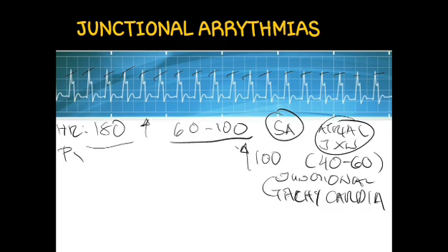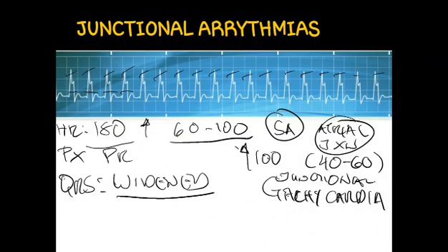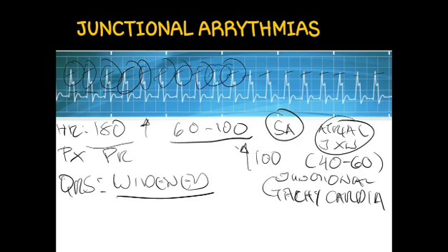So again, P wave is absent and we cannot determine PR interval, but then the QRS complex, as you can see, is widened. Okay, there is a widened QRS complex, and this one, guys, here at the top, signifies bundle branch block. So meaning there is also a blockage in your bundle of His. If the blockage occurs within the bundle of His, we call that an infranodal block. So meaning that block also appears on the bundle of His itself.